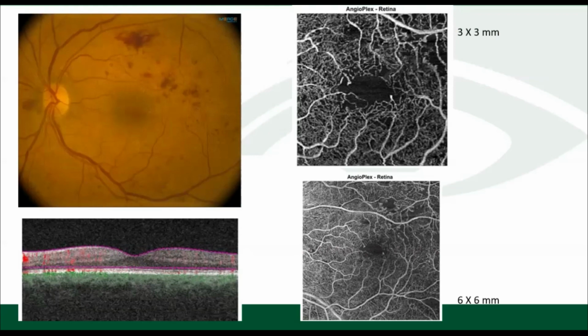And you alluded to the need for wide field angiography, and we're getting there, I think, with OCT angiography, and we're able to do the montage. But that's really, at least in this case, the limitation, right? Where you're not able to see, are there any areas of neovascularization further out that we're just not able to see or pick up? And I think this would be a great example to show that if we had it. But again, from a primary care optometric perspective, this is a patient that I think needs to be sent out, obviously, to the right place and ultimately, you know, maybe treated.